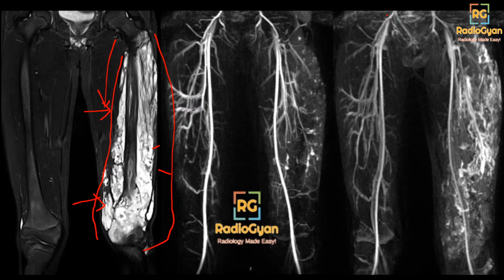On the early arterial sequence, we do see a few blips of contrast, but we don't see any arteriovenous shunting. So most of these are arteries, we don't see any veins yet. However, in the delayed phase, you see that this lesion has started slowly picking up contrast. So you see here it started picking up contrast. So this is a case of slow flow venous malformation.